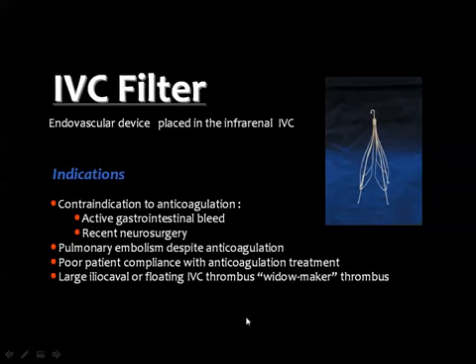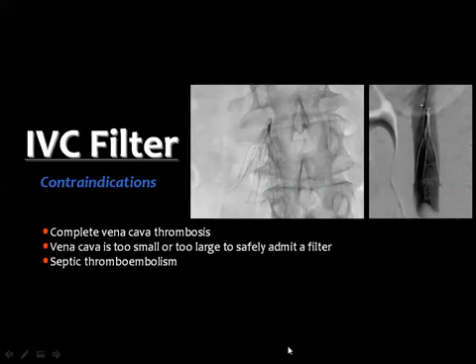This is very important. If the thrombus is floating and you can see it by Doppler, you should prevent this thrombus from reaching the pulmonary circulation. Then you put the IVC filter and ensure the correct position of the filter.